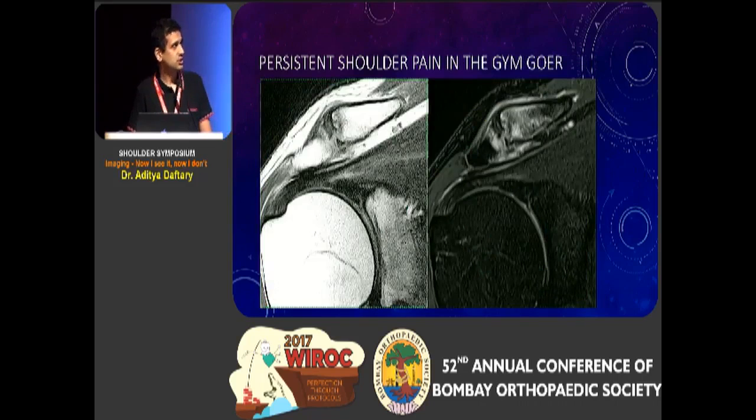Here's another patient who is sort of a bench-pressing, bodybuilding type, who showed up with shoulder pain with a normal X-ray, and here you can see distal clavicular edema, and you have a distal clavicular stress reaction, which is a common thing in these people, which will produce significant restriction of movement.